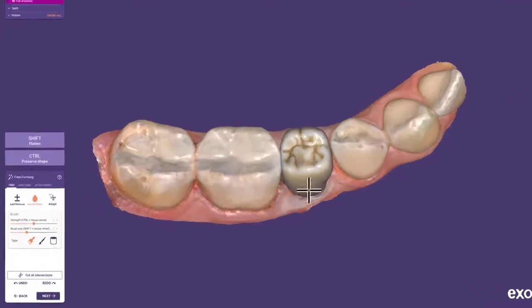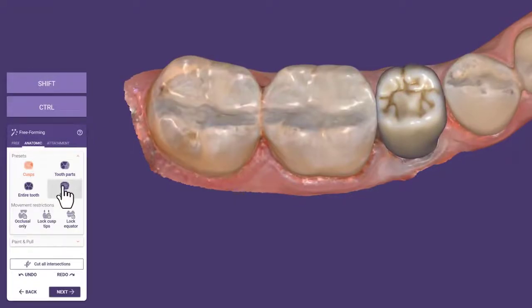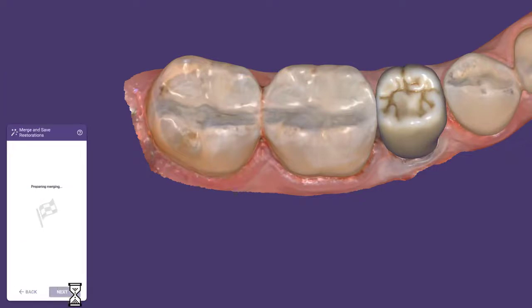And second, by highlighting the affected area. Here, the green marking indicates the area that will be affected. This way, you know exactly what to expect from the tool you selected, even before you start using it. Magic.